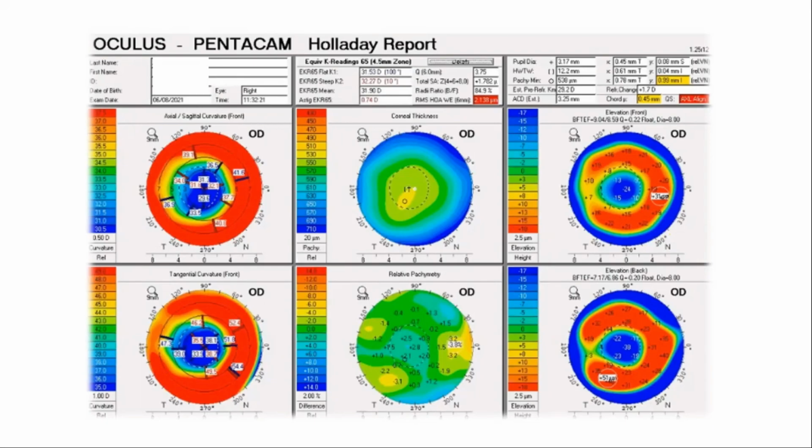So maybe I'm just guessing that this report will also be useful for IOL implantation in keratoconus, because in keratoconus the surfaces will be irregular, so irregular that the ratio will be altered. So maybe in very irregular corneas after refractive surgery, and also in keratoconus, this report will be useful.